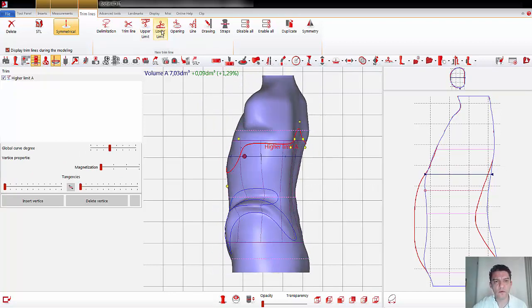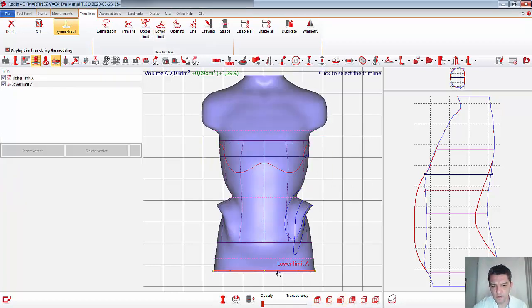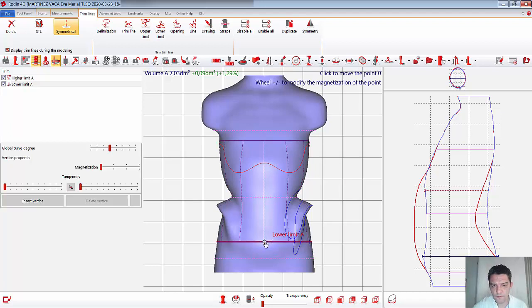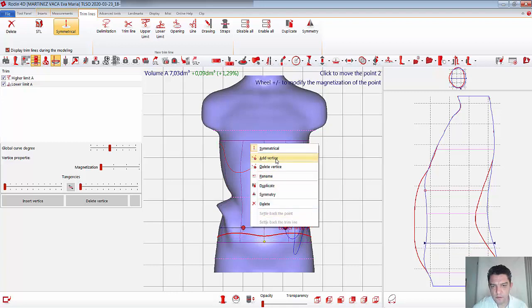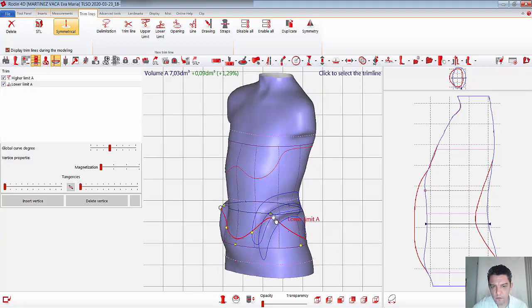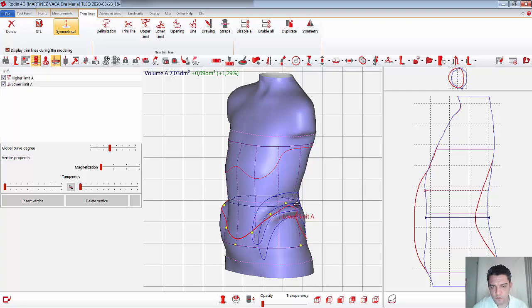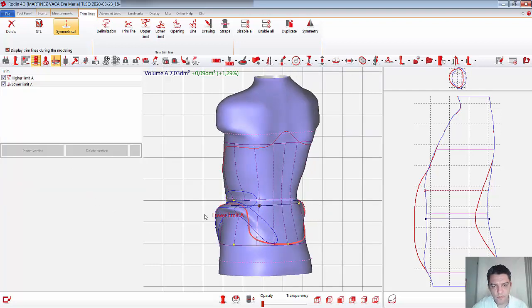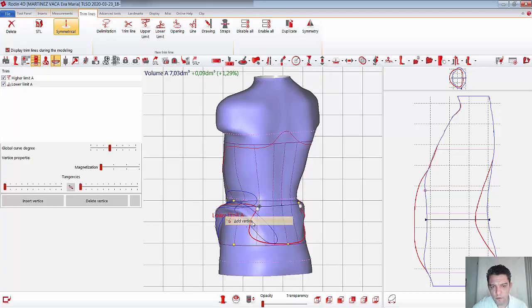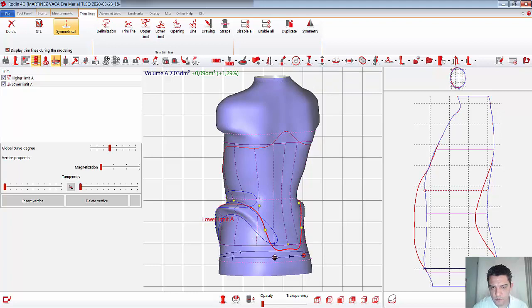Perfect. Now I want to draw the lower limit. So here I want to start moving the level to the top. More levels, more levels, more levels, more dots, sorry. Okay, this one I want to leave approximately here.